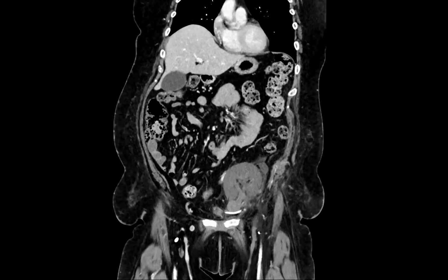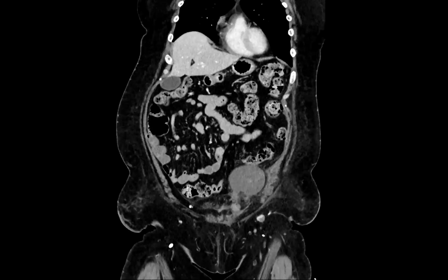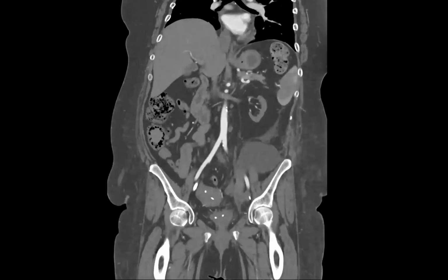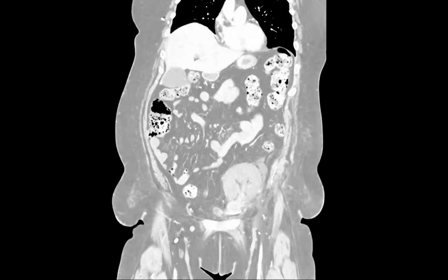What do you see? Nothing. So this is a patient who had a renal transplant, and we got a multiphasic CT. It looks very hypovascular. Okay, so that's the venous. So let me give you the arterial. It's right here. Oh, that's not helpful, but here it is.